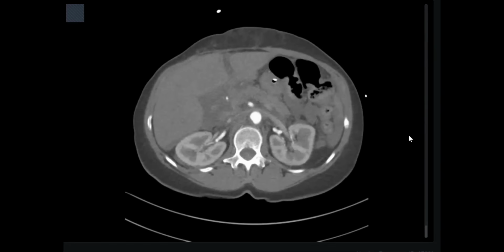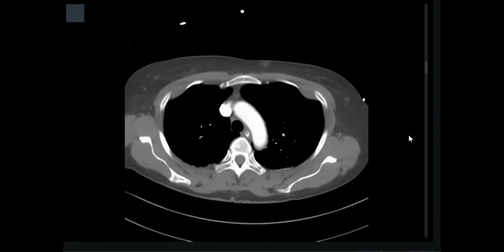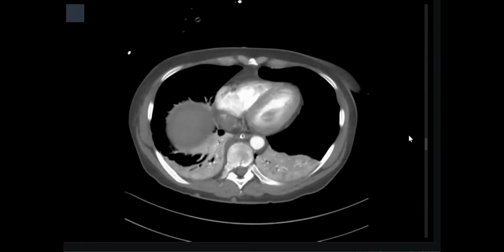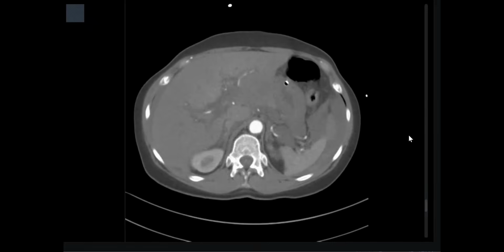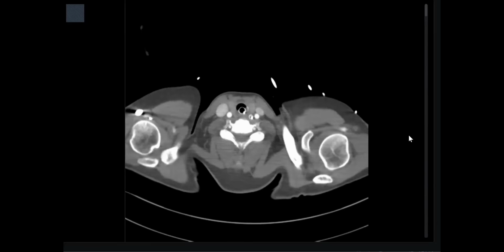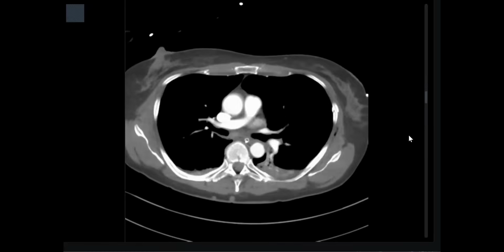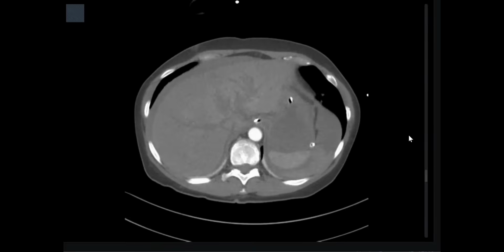Okay, so I'm presented with a CT scan, axial slices through the chest in arterial phase. I just went through the scan quickly. I'm just going to have one more scroll so I convey my findings. So there is an enteric tube placed in the esophagus, and the tip seems to be ending in the stomach, the distal stomach actually, in the appropriate place.